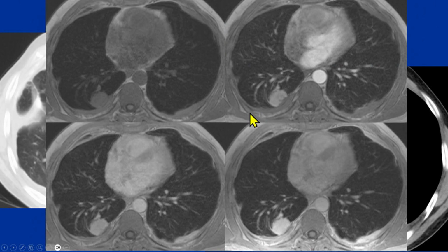As you guys know, when you have a VIP patient, oftentimes those VIP patients get the worst care, right? And so this was a VIP patient and they didn't want to get any more radiation exposure. So we started imaging this patient with MRI scans, which they paid for out of pocket. This is just an example that if you wanted to, you can image these patients with pleural abnormalities with MRI. This is non-contrast, then this is arterial phase, and eventually we have the delayed phase here.